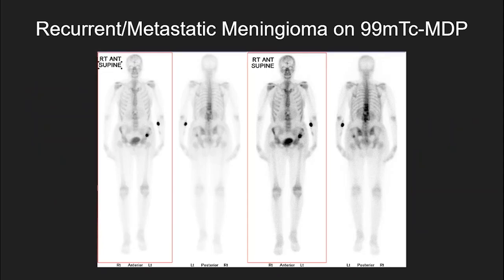So now let's turn to some examples. So this is a bone scan in a young female patient who had previously had resection of a large anaplastic meningioma centered in the skull, particularly along the falx. And what you can see on this bone scan is that if we window things appropriately, you can often pick up meningiomas on bone scan. And hopefully what you can see overlying the frontal bone is some uptake within the recurrent meningioma that this patient suffered from in the skull and brain.